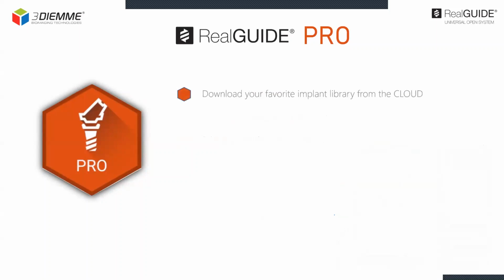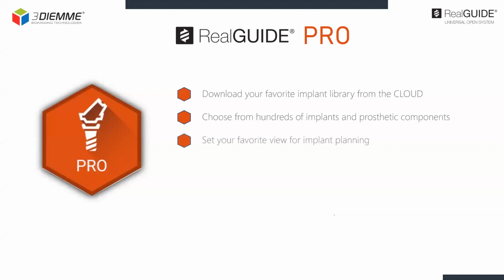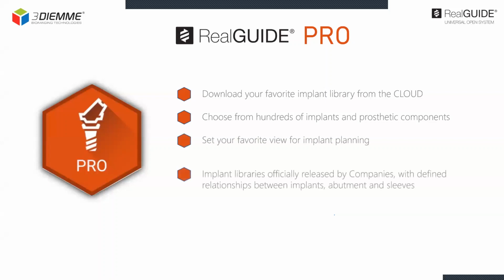Download your favorite implant library from the cloud, choose from hundreds of implants and prosthetic components, and set your favorite view for implant planning. All implant libraries here are officially released by companies, with defined relationships between implants, abutments, and sleeves, and artificial intelligence based on teeth and bone segmentation.